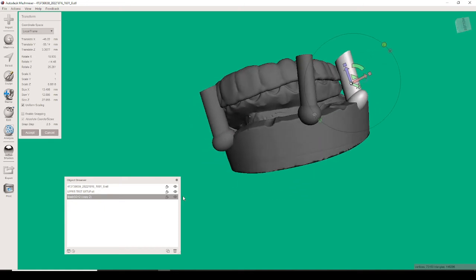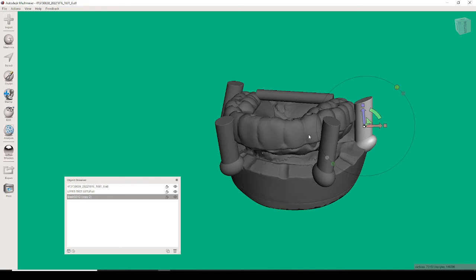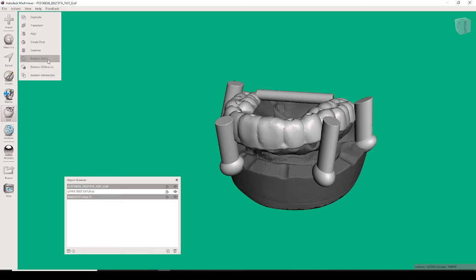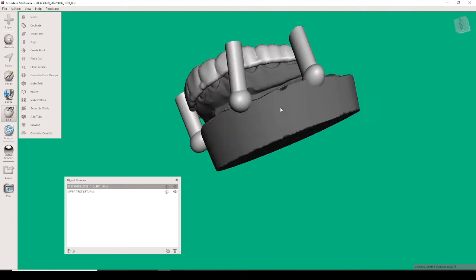All right, let me take a look. Make sure there's no interference. We got proper connection. Excellent. All right, enter. So now we're going to connect the last leg. Make sure that's working. I'm a little worried that one of these positions is not perfect, but we'll take a look.